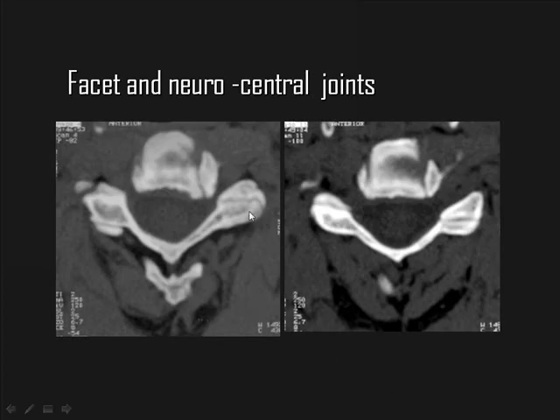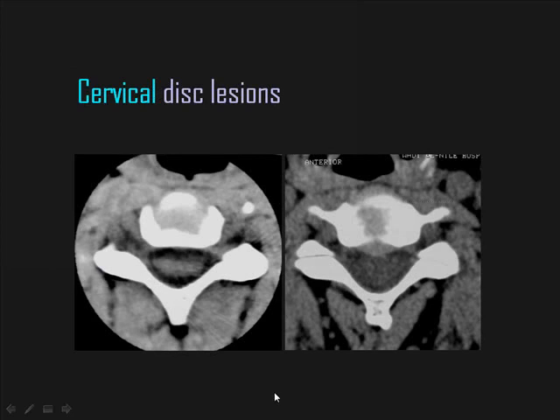In cases you have osteoarthritis of the neurocentral joint, then you see narrowing of the joint space, osteophytes that markedly narrowed the joint, the nerve root canal compared to the patent nerve root canal on the opposite side.